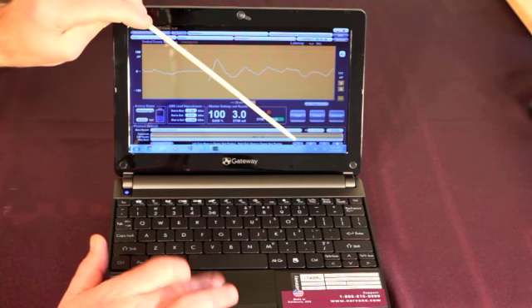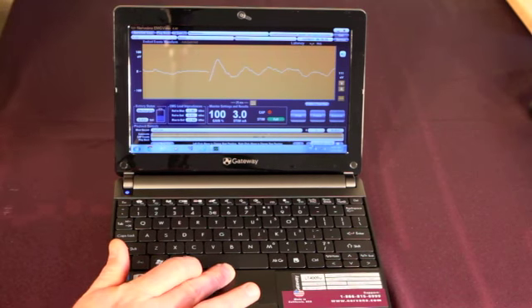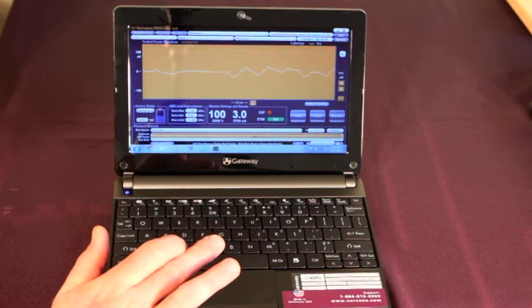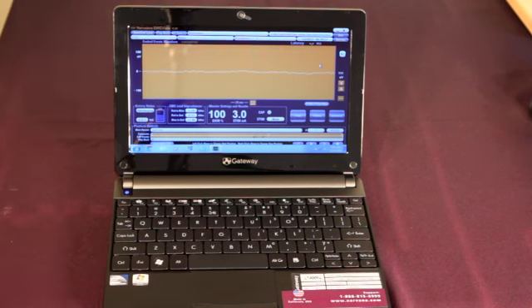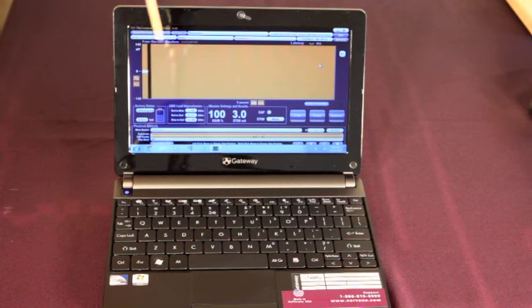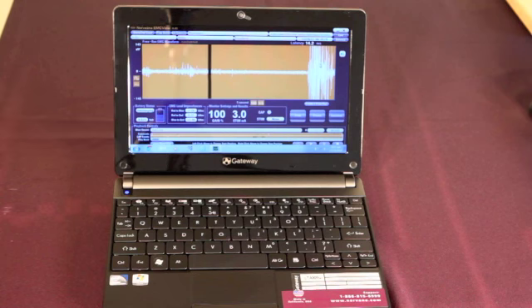When I click on that, the start and stop points are reset, and when I push play or click on the play button, you'll notice here now I'm seeing data transmitted, the line's beginning to move, and my blue bar starts advancing now again from the beginning of the recording. So that's a good overview of the playback features.